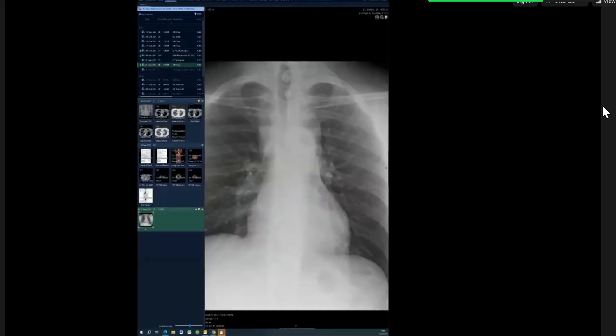So mediastinal mass, they want all those fancy signs. They want you to explain why it is where you think it is. Even if you called this posterior mediastinum for some reason, but you gave your thinking about why you think it's a posterior mediastinum, it can possibly still take you to a pass. But this one, you said widening of the superior mediastinum.